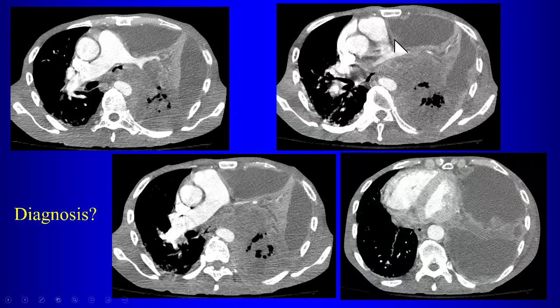Yeah, you see all this stretching of the vessels. Here in the left lower lobe, there's a necrotic mass. See these lucencies in there? That's a necrotic mass here in the left lower lobe. Okay? So this is a patient with lung cancer and metastatic disease to the pleural surface, resulting in this large pleural effusion with these adhesions.